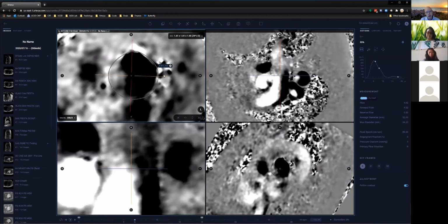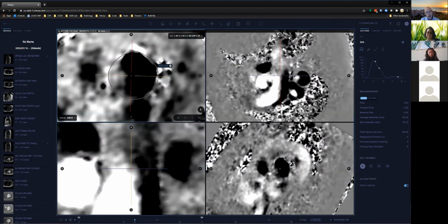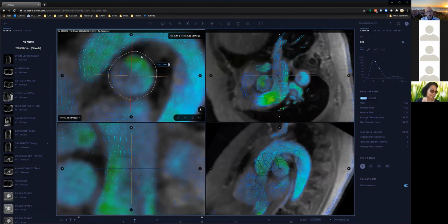So there's a couple things in the lungs. There's a lot of noise. There's high velocity positives and negatives. I don't worry too much about that. In general, on average, they average 0. But if I was more careful, I would also exclude those as well. But the key things to avoid are really to avoid segmentation of the adjacent vascular structures.